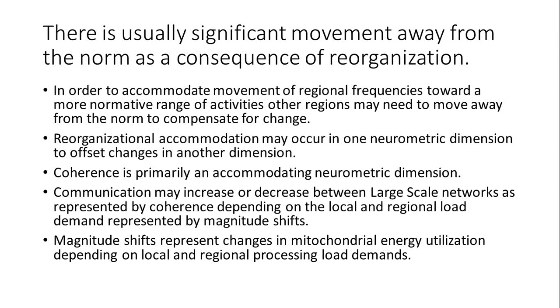The more you use your frontal lobes to solve a problem, the more your brain is going to inhibit activities that push you more towards self-referential thinking. You're doing an externally oriented task using the executive network. You're going to utilize the default mode network a little bit less. It's not a complete abandonment. It's just a little bit less. There's a 15% change in energy. The salience network shifts most of the resources frontally. Magnitude changes, and there'll be commensurate changes in communications and coherence. You can see that.